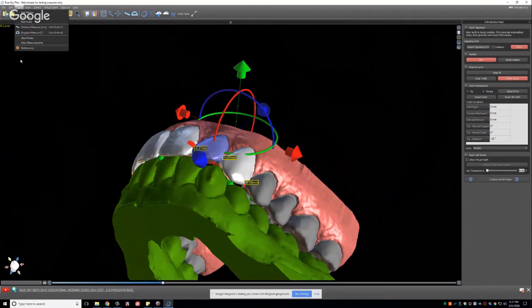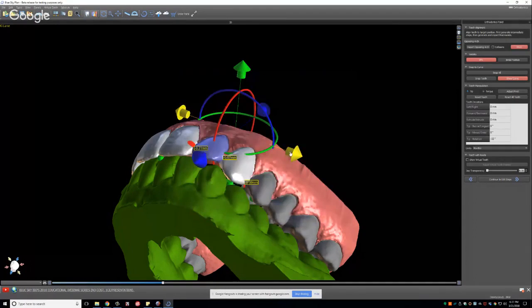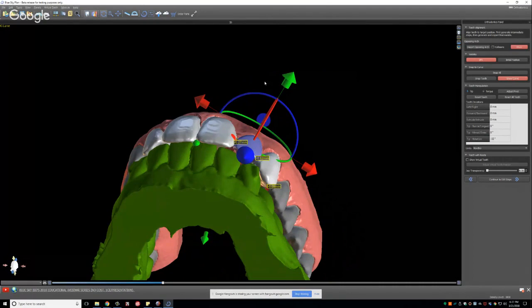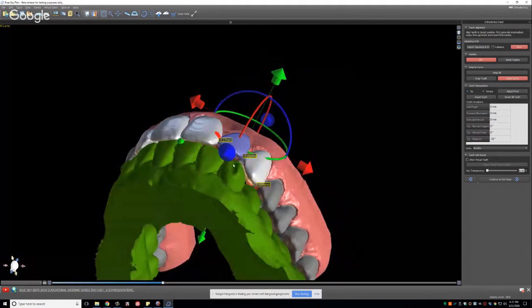Just for reference, I set mine at 0.05 and 0.05. That is the point at which the numbers show up. The default currently, I believe, is 0.3 and 0.5, or it might even be 0.5 and 0.5. I would recommend dialing that down just a touch. We will change that default in a very soon update.